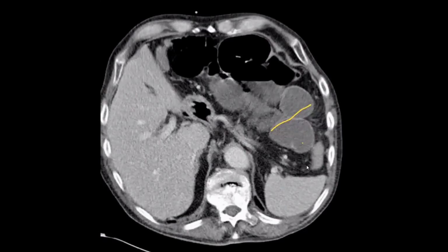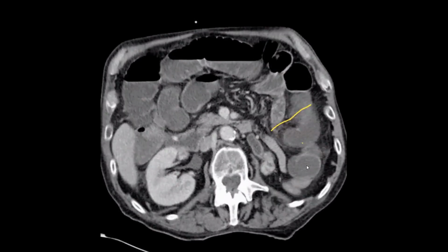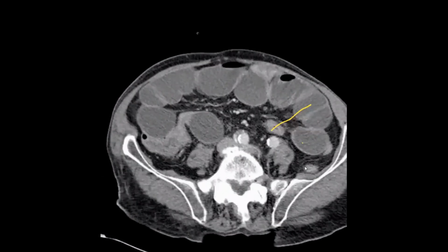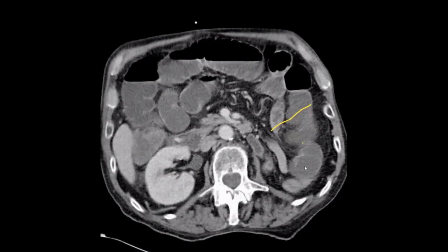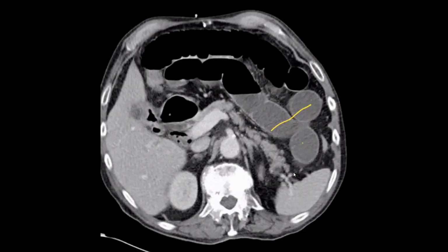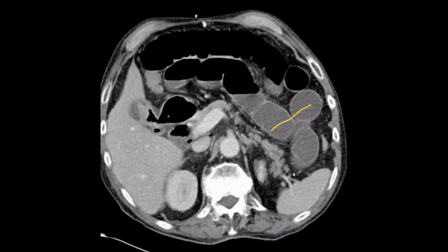I am trying to look for gallstones, but I can't see them, although I can appreciate fluid in the region of the gallbladder fossa. If I combine these findings, the calculus within the bowel, small bowel dilatation, and the air within the biliary channels, this is Rigler's triad. So I would immediately inform my findings to the referring physician, to the emergency department.